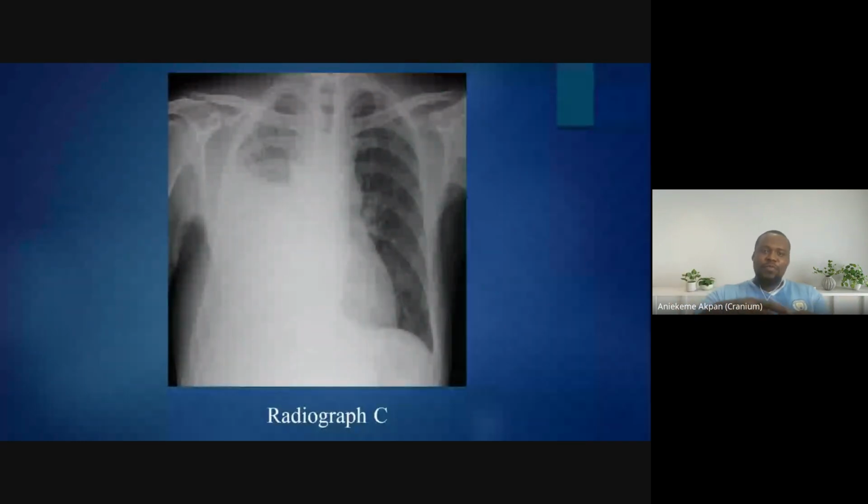It could also be a mucinous collection. So generally, they consider this fluid as an effusion. It's only history, most times, that helps to differentiate it. Heart failure can cause pleural effusion. Accidents can cause pleural effusion. This time around it could be hemothorax.